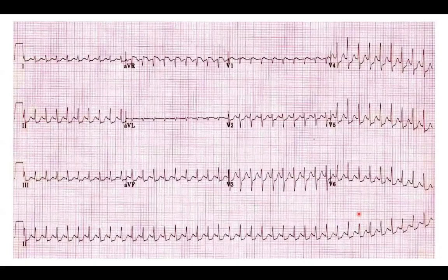Okay, and so we're back to a tachycardic regular rhythm that looks narrow complex, so we're looking for our P waves. We see some areas that aren't quite as smooth. We think we see some notching, and these are actually P waves, and in V1 you're seeing much the same.